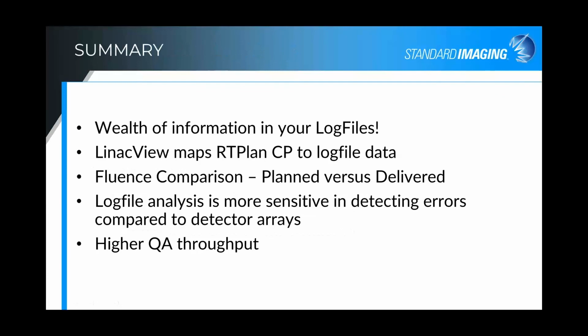And so in summary, I hope that I've convinced you that there's a wealth of information available for analysis within your log files. The LinacView software maps the RTPlan control points to the log file data. Gamma analysis of the fluence occurs so that you can compare the plan versus delivered. Comprehensive analysis tools are available, and log file analysis is more sensitive in detecting errors compared to detector arrays and allows for higher QA throughput.